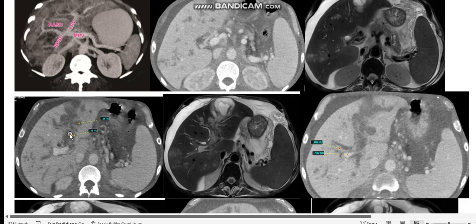Okay, so this is suspected to be a thrombus, and the T2 weighted MRI confirmed that this filling defect is a thrombus, because this is the normal signal void seen inside the normal vessel. Okay, this is the high signal of the thrombus.